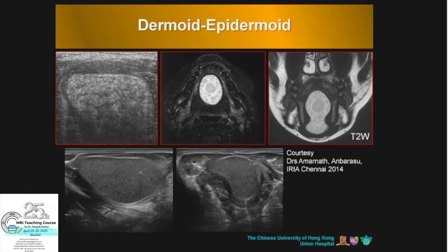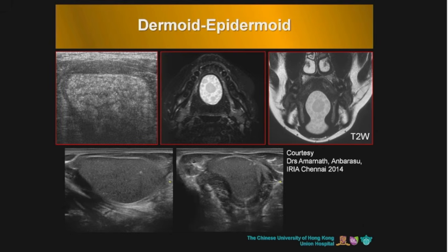Normal anatomy should have been anterior belly of digastric, mylohyoid muscle, the geniohyoid, and the 2 trouser legs of the genioglossus. I am not seeing the geniohyoid, I am not seeing the genioglossus. Again, this is your first clue.